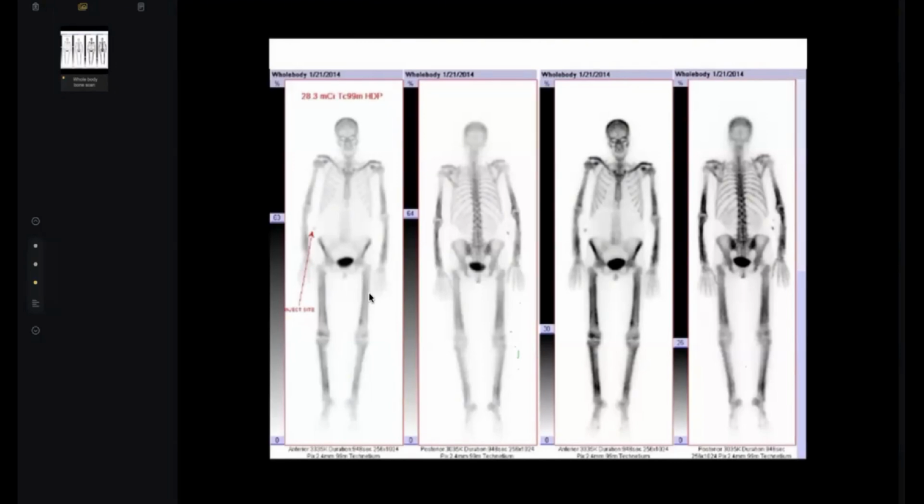What happened here? It says there is periosteal uptake in the femurs and the bilateral tibia. Is this symmetrical or asymmetrical? This is symmetrical in the upper bones as well, in the humerus and the forearm bones, radius and ulna. Your final diagnosis? This is hypertrophic osteoarthropathy, which is causing symmetrical periosteal reaction in the bones as a result of the lung cancer.